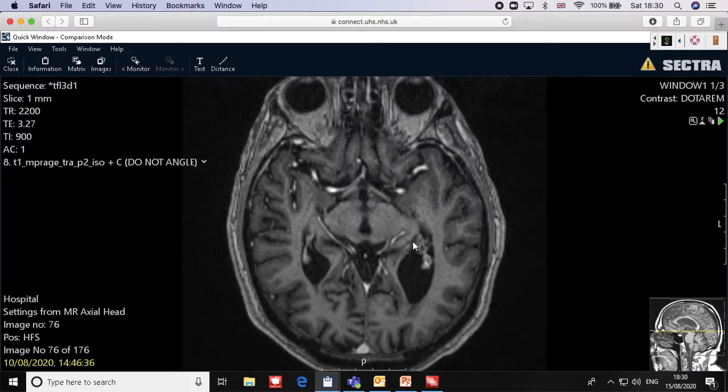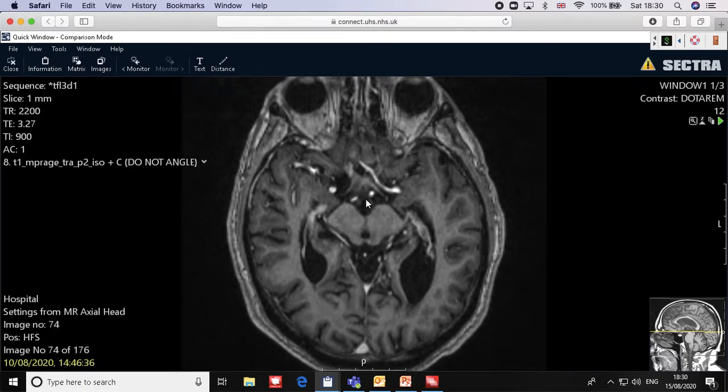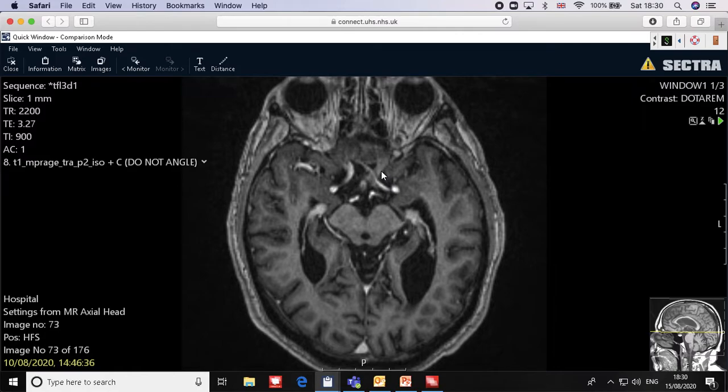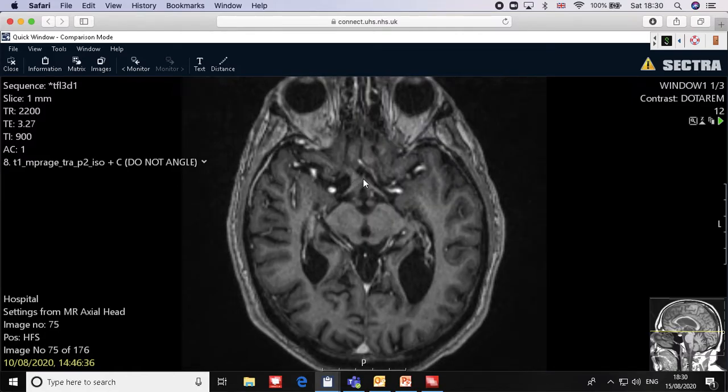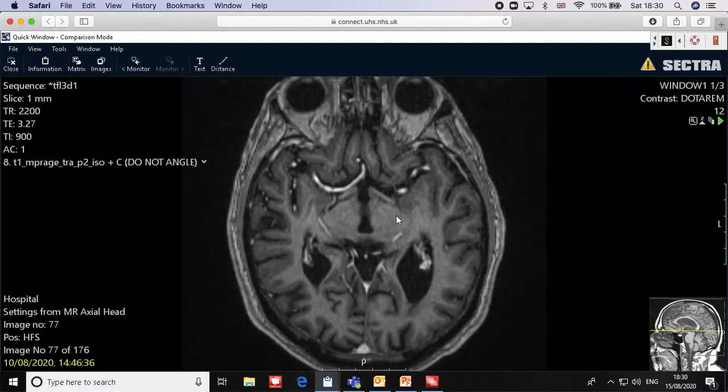The chiasm in MRI is beautiful. It's very, very easy to localize the optic chiasm in MRI. You can see it here, and even if it's interrupted like that, you still can see it. You can see the optic chiasm, and you can see the optic tract on either side. You can see it clearly, you don't have to worry. This is the optic tract. So it's easy to draw the optic chiasm in an MRI. I think the talent would be to draw it on the CT. Let's see the hypothalamus.